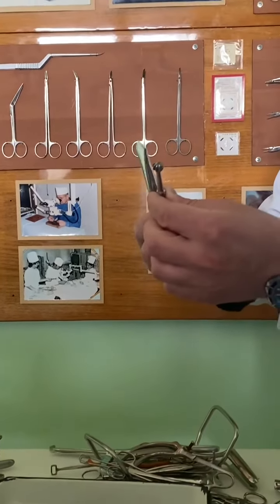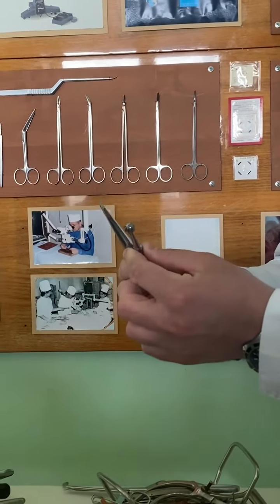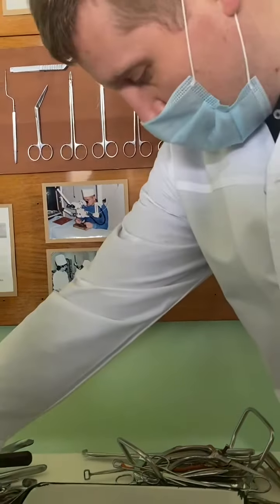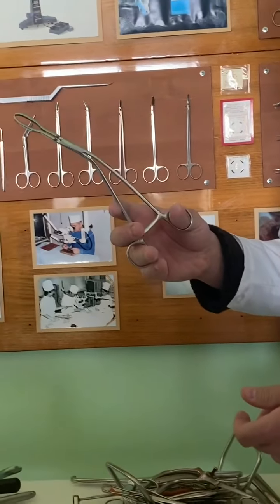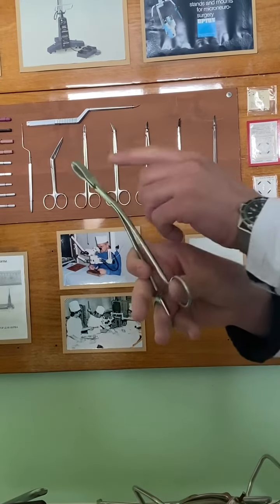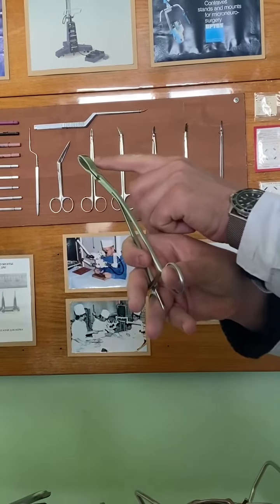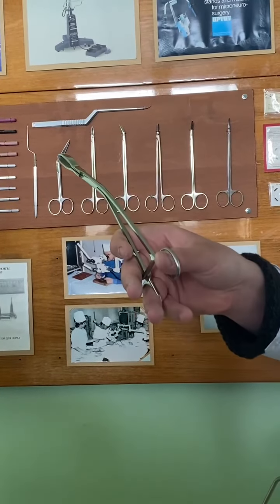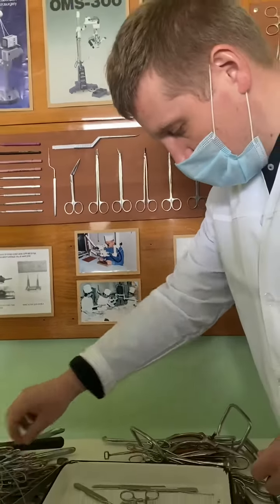Here you see two types of drills, lancet-shaped and globular-shaped drills for drilling of the skull during trepanations. One more instrument from future topics, the instrument for operations on parenchymal organs, and the transverse section of the organ looks like a hole between branches, the tail of the pancreas, for the tail of the pancreas.